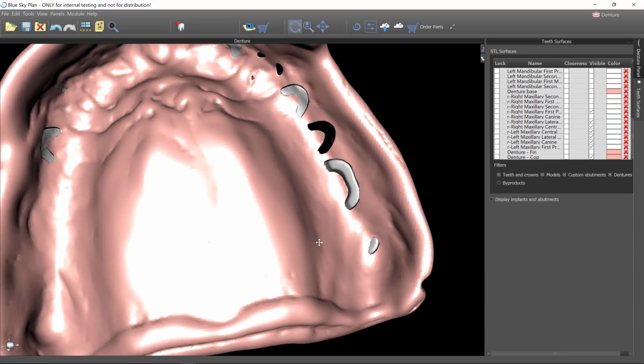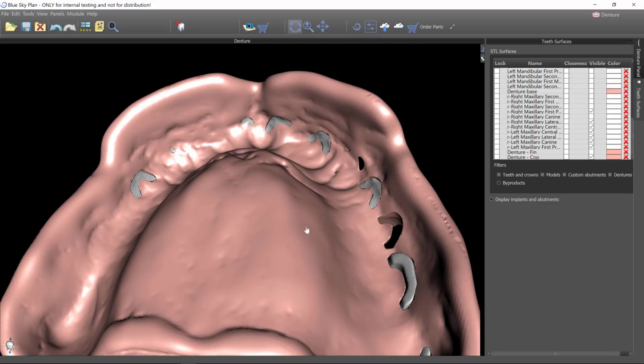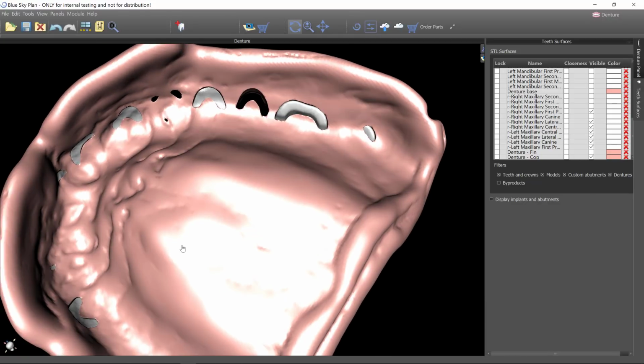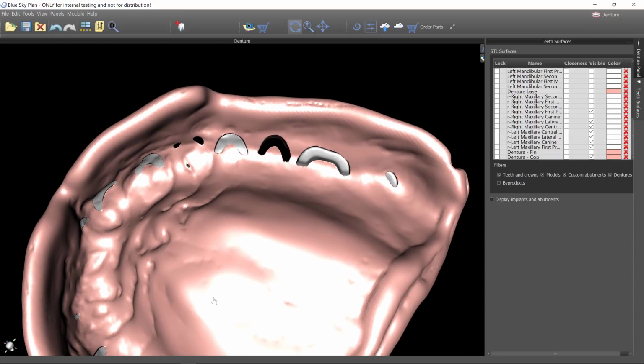So the reduction coping is basically the equivalent of what you would get back from your lab. So let's say you sent a crown off and they say, hey doc, you've under-reduced, and you say, well, I want you to finish the case. What they're going to send you is a tooth reduction coping, which you would drop on that crown prep, and it would tell you, hey, anything sticking up beyond this is where you need to adjust so that this crown I made will fit. This is the exact same thing.